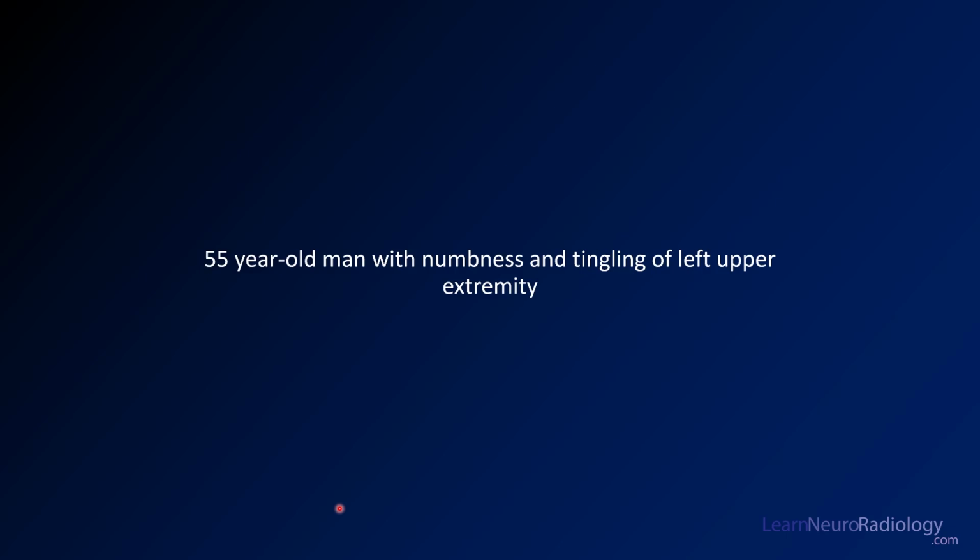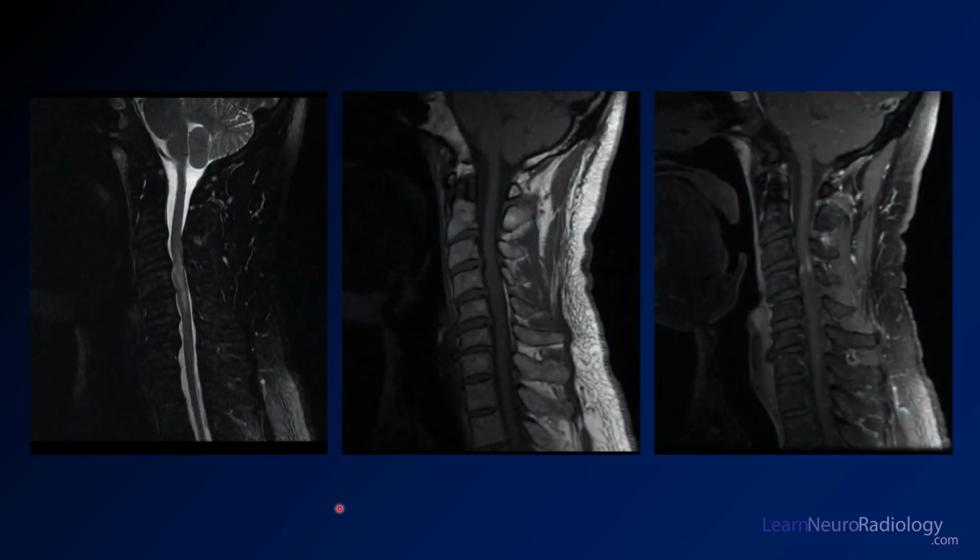For this next case, we have a 55-year-old man with numbness and tingling of the left upper extremity. Again, you see cervical spine imaging, and you see findings which are pretty similar to that previous case. Starting around C3, extending to C5, you've got some heterogeneous abnormal T2 there. On the pre-contrast, you don't really see anything. And on the post-contrast, you see some enhancement. But unlike the other case, the enhancement here is around the periphery of the cord.